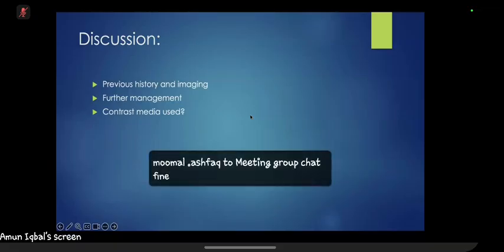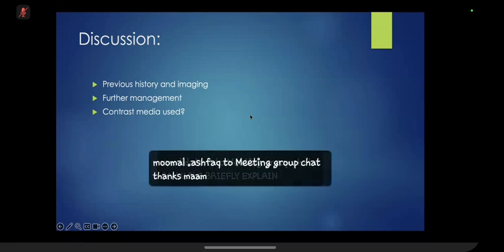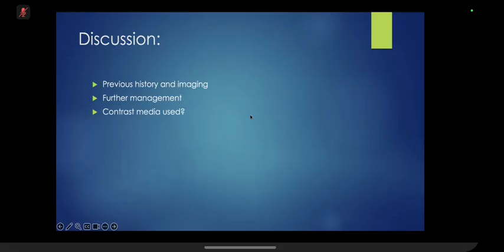And regarding the classification, we try to avoid that, because sometimes people have different opinions on different types of classification, and the surgeons, especially pediatric surgeons in Saudi Arabia, don't like that we classify which type of fistula is there. So we try to avoid putting that in our reporting PDFs. So now I would like to show you, once again, the malrotation.